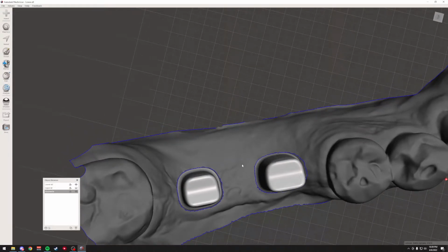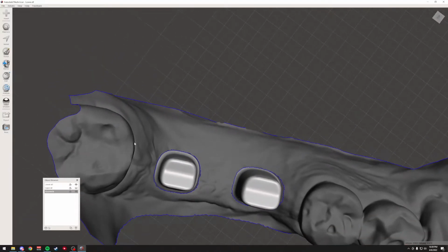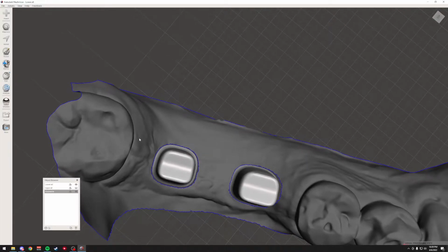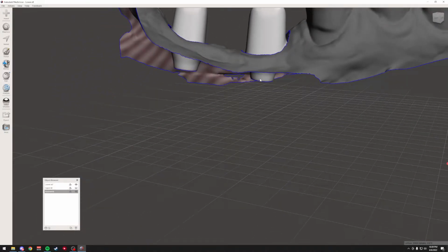For any doctors watching this, really the only situation that you would specifically run into is probably going to be if you're trying to print models to check things and you get an STL back from like Atlantis or a true abutment where they are unable to send you a digital analog that you could just snap in there. So this is a way you could do that. I know for most docs doing those cases, you're probably not checking them. You're just designing them, milling them, and then you'll try it in the same day. And you can always tweak that if you need to. But this is a way to kind of solve that problem.